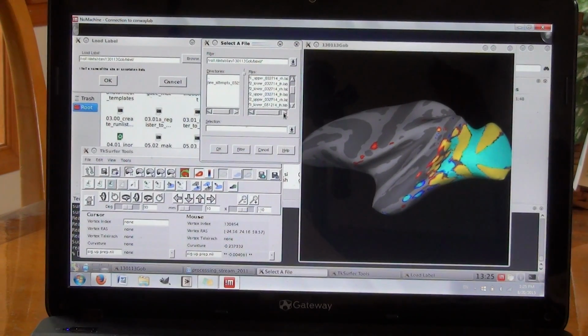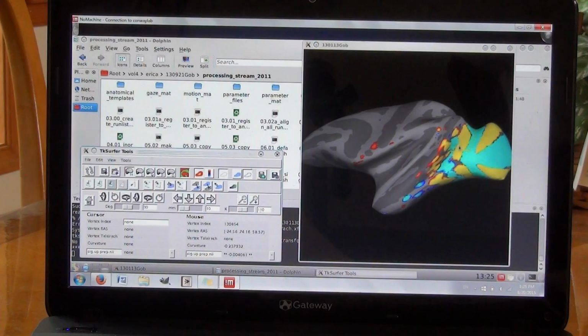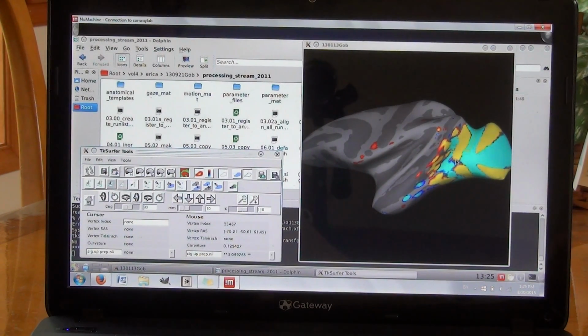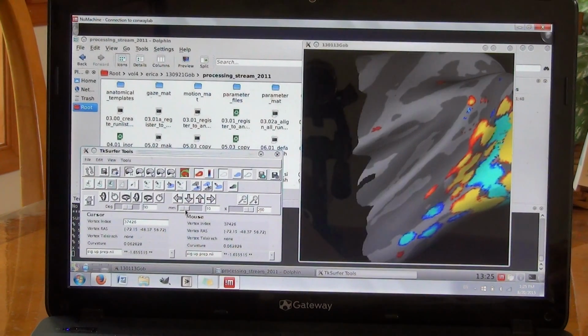And when I say make a label, this means that right now I will be outlining V4 on this brain, and this will create an outline on the pictures of the brain that tell me where I can color in to label V4. So this label is yellow right now because it is selected, which is sort of like when on the internet you highlight text and it's blue because that's selected. So you just click out of it and it's not. And I'm going to zoom in.